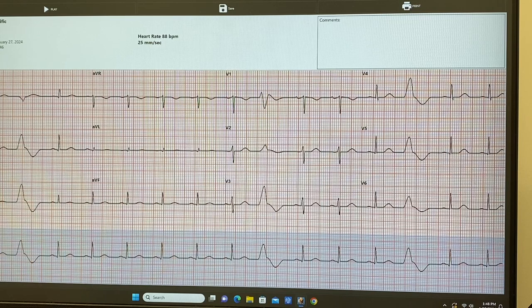And we already know with the rhythm, you said it's regularly irregular. Okay, good. So we got a premature beat. Now we got to find out what kind of premature beat. So continue through all your analysis. I'm looking at if the P waves are normal. I have a P wave here.